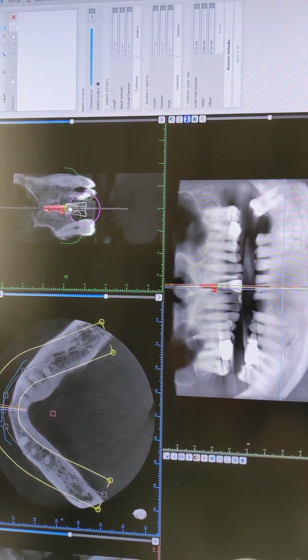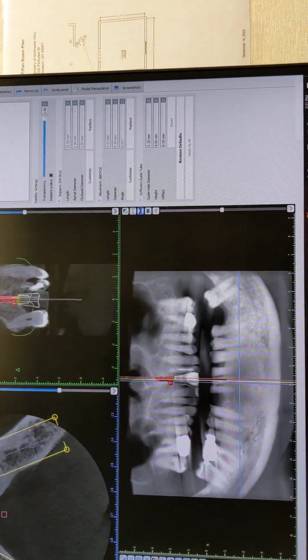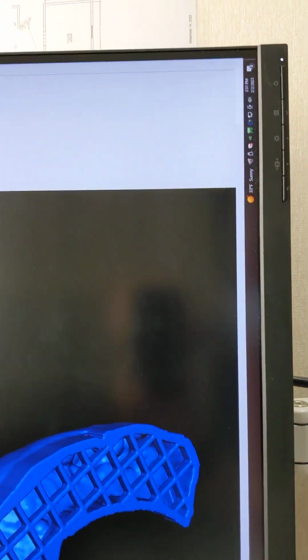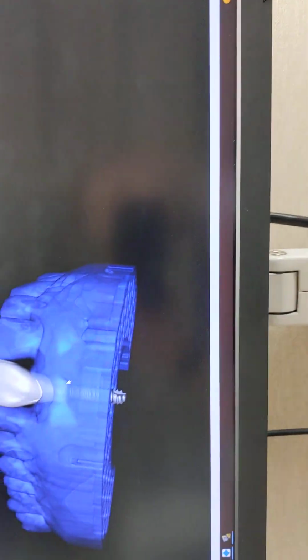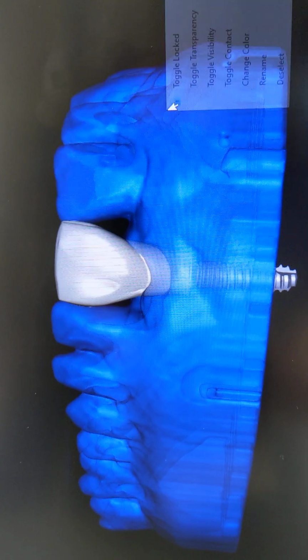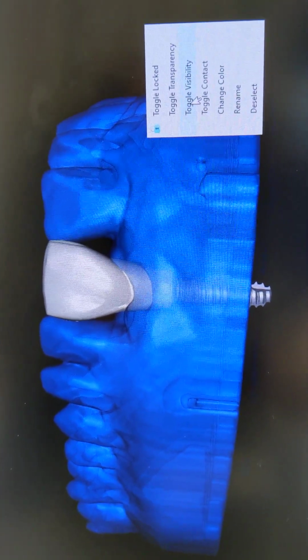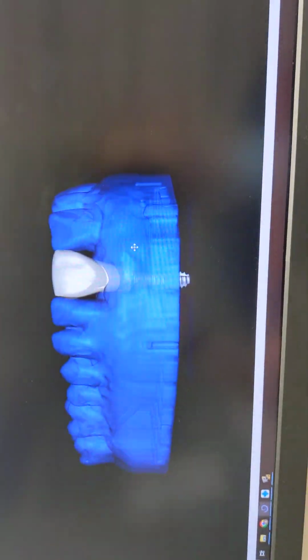And Biomax implants, if you go to the crown and bridge module, they have tie bases, which, if I toggle transparency, you can see here. Okay? Heck, if I can just hide it. Well, no, I can't, because then I won't be able to get it back. But whatever. Or it won't be as easy. Okay, so you can see there, right? There's an actual base there.